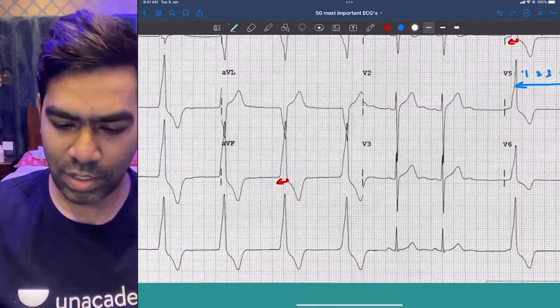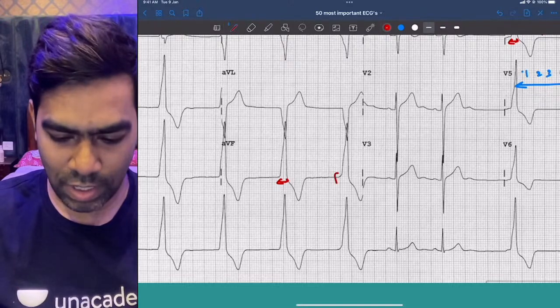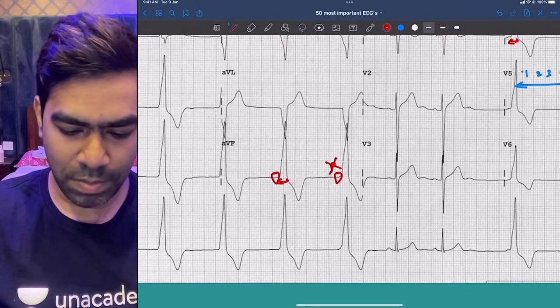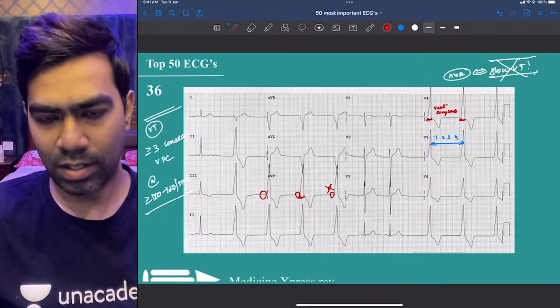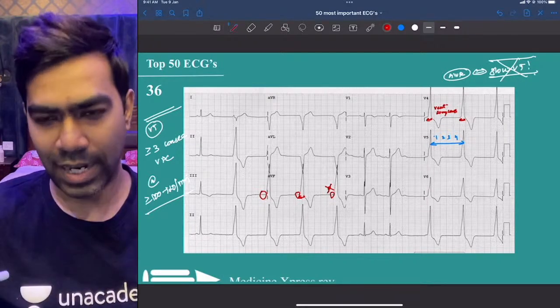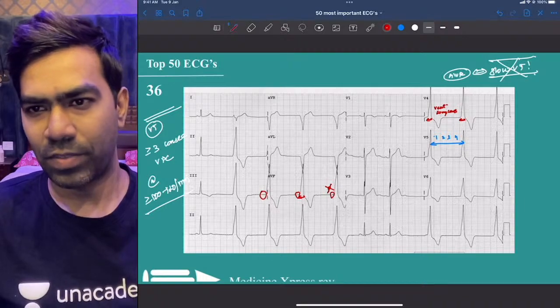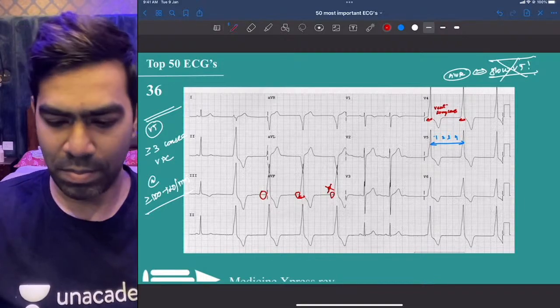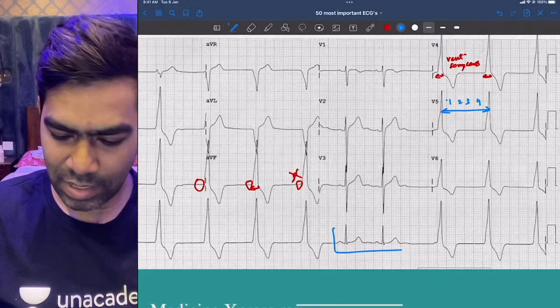And look at this. This is not a sinus beat. You can ask whether it's a bundle branch block or not. No. Look at this, there's no P wave. I'm not seeing any P waves at all. So this is a true ventricular rhythm, and there are no sinus beats in this EKG, and this patient is having accelerated idioventricular rhythm. Maybe in this area you're having sinus impulses.